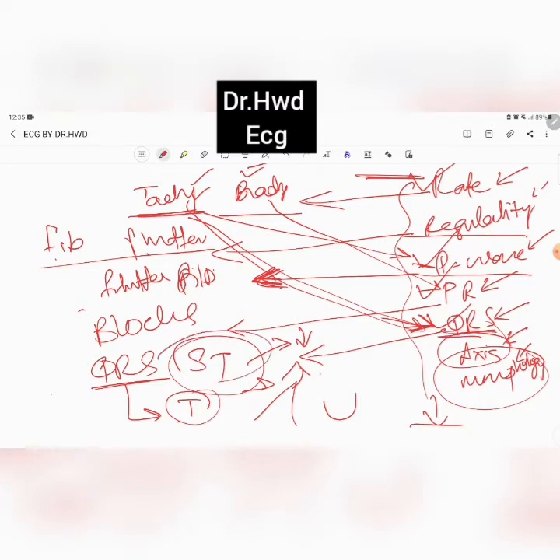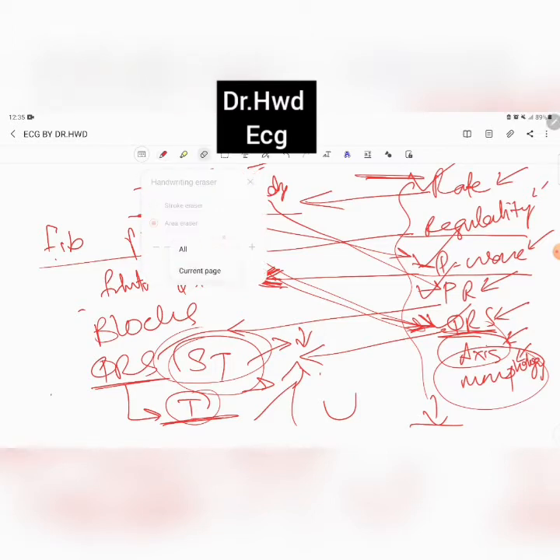Your ST segments and QRS would tell you, when you look at the ST, if there is an elevation or drop, to see whether there's a depression, whether there's an ischemia or an infarct. Your T waves will tell you whether there's hyperkalemia or hypokalemia. This is all you need to know about your ECGs. Now let's move to the ECGs in here and see what we learn.